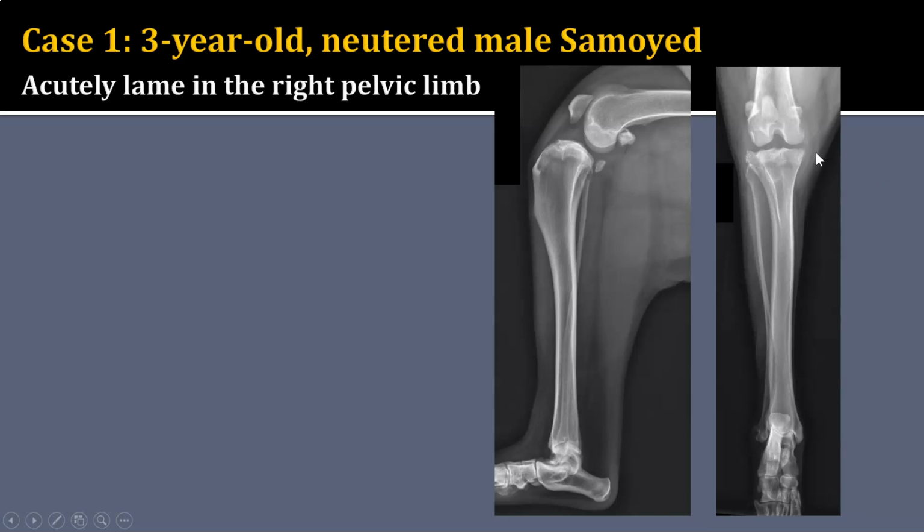I see a little bit of soft tissue swelling that is more medial to the stifle on the cranial caudal view, which may actually be some extracapsular swelling. So next I want to look at the bones themselves, and when I'm looking at my study, I usually go proximal to distal. So I'm looking at the cortex, the medullary area. And when I get down into the joint, I'm going to look at the periarticular areas as well as the joint surfaces. And in this patient, I'm noticing some mild but present periarticular changes.